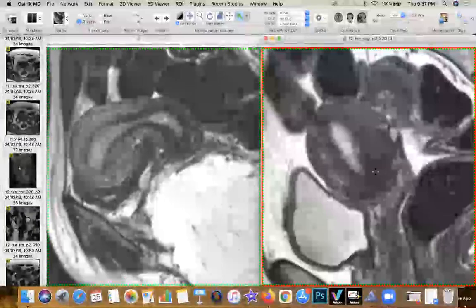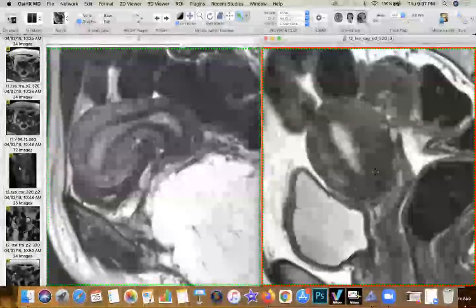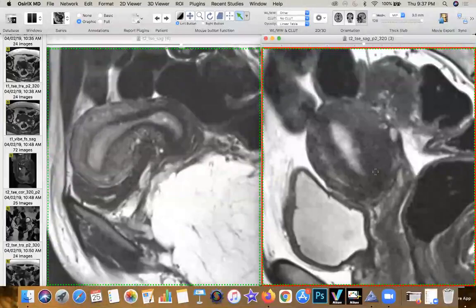When you get to see a fibroid, they're relatively well circumscribed with lobulated margins, whereas adenomyosis and deep pelvic endometriosis invading the myometrium both tend to have indistinct margins with the surrounding myometrium. Of course, how do you differentiate adeno from DPE? It is by relative sparing of the junctional zone.